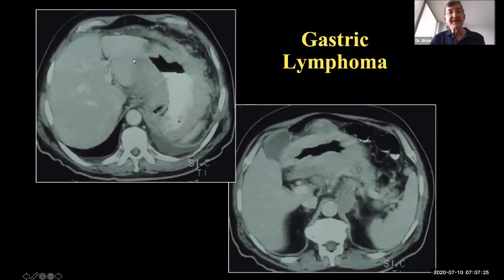But note the indistinctness with the left lobe of the liver. This is indicative of that continuity of the subperitoneal areolar tissue within the ligament with the perivascular fibrous stroma within the liver, the so-called Glisson capsule, allowing that direct spread of disease straight into the liver.